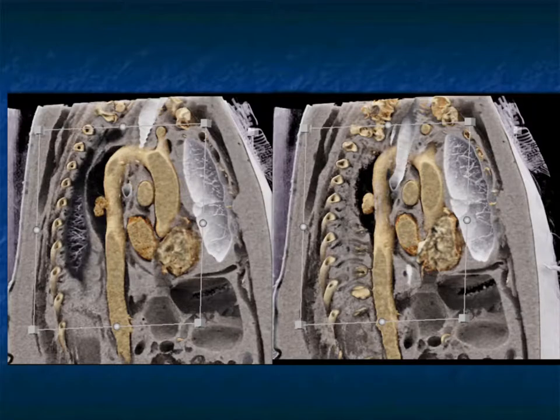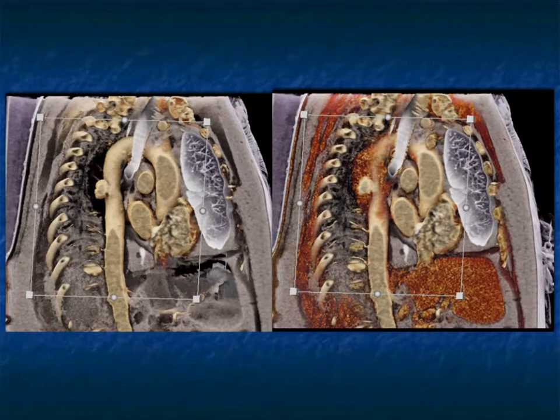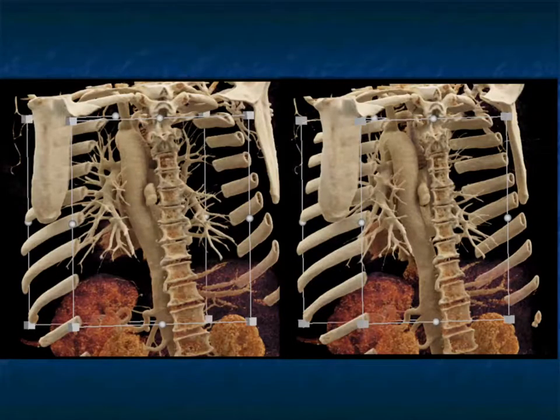On the sagittals, without the cinematic rendering, we saw everything, but you can imagine why the cinematic is better, looking at the luminal diameter, looking at the entire volume, and helping the surgeon plan what they need to do. It also shows you how much information you have, depending on how you vary the rendering technique.